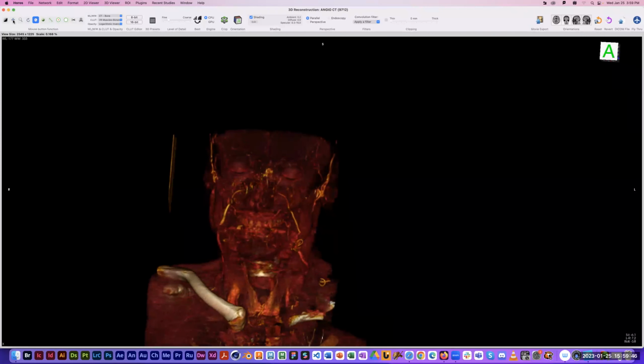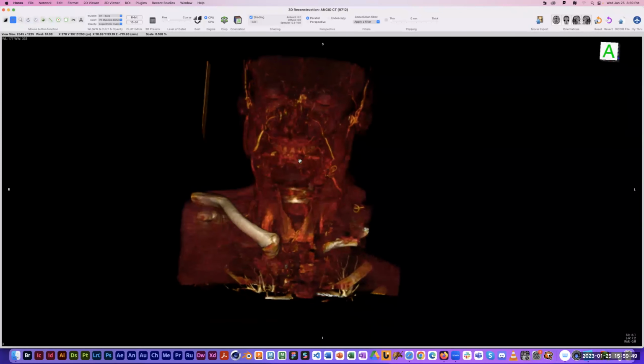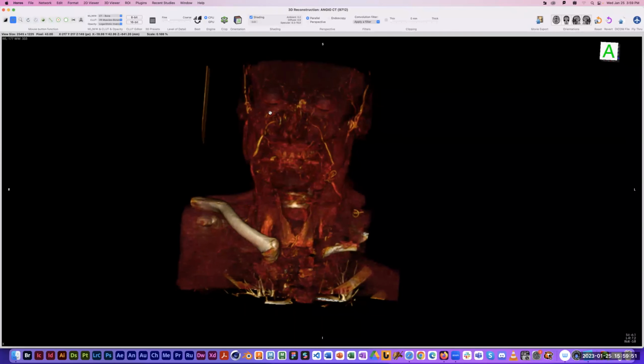So go explore Horos. Since this actually worked better than I was expecting, I'm just going to play with this for a little while and see what kind of fun things I can do with it. But let me know if you run into any issues with this.